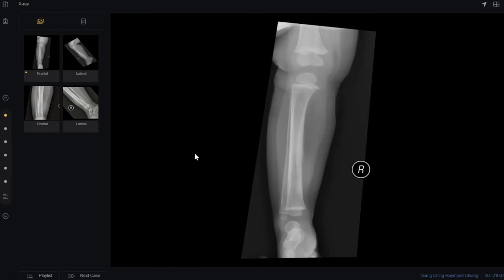However, there is also some geographic, moth-eaten type lytic lesion with a wide zone of transition noted just beneath this shaft within the medulla of the tibia. I can see that the periosteal reaction overlying it is laminated in appearance, and I cannot see any cortical break here. In my normal practice, I would like to zoom and change the window. However, looking at this, I summarize that this is likely an aggressive bony lesion with differentials of Ewing sarcoma and osteomyelitis.